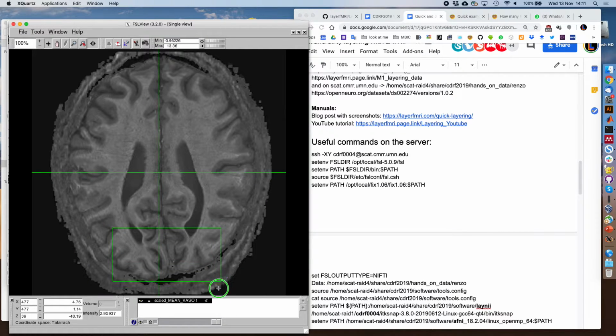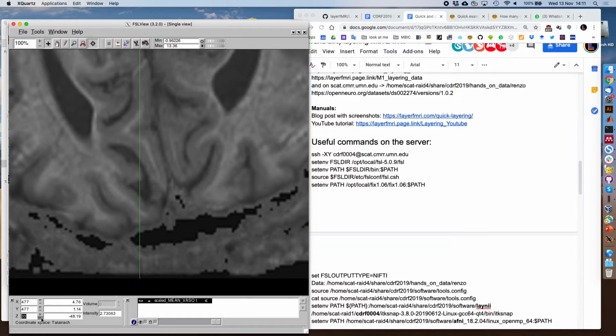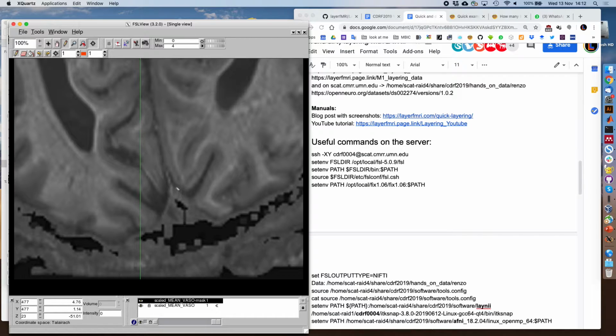After upscaling, it always looks nicer. So here, for example, let's go a bit down again. There's some huge delay. You might even see the stria slightly better if you wanted to see. Okay, it stopped. So now again, I'm drawing the rim. Create mask. We have a mask. So again, now I'm drawing with ones.